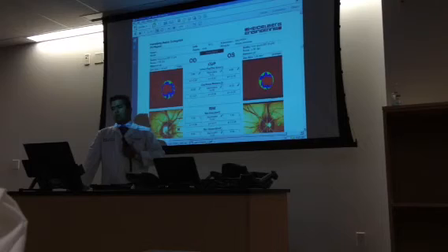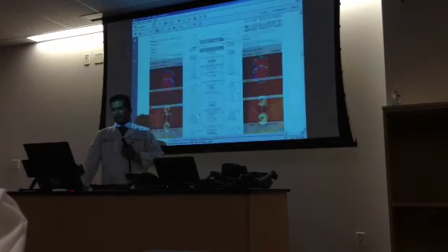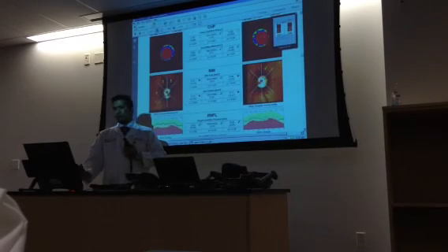Okay. So go ahead and interpret one HRT. You can do page number 6, page number 7, whichever you want. But do analyze one, and then we will have to look at OCT.